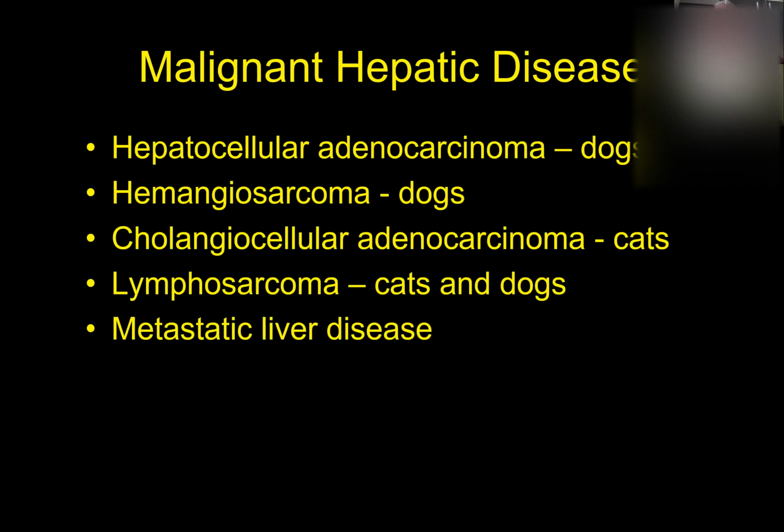Again, if you were at Vegas at the radiology craps table and they said there's a tumor in this cat's liver, and the cat's middle aged to older, what are you going to bet? If it's a cat and it's caudal to the neck, you should probably always bet lymphoma. That's going to be the most common one.